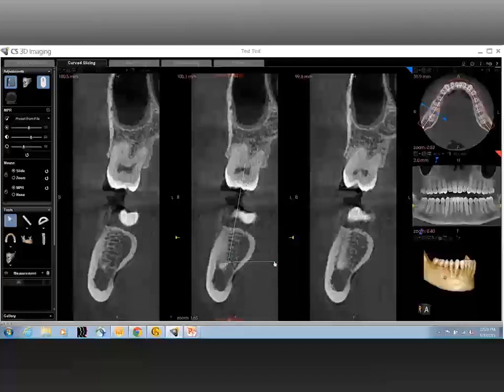Now how does it help you in terms of implant evaluation? In cases where loading of the implant becomes critical, especially in the posterior area, it is good to identify that angulation of the ridge to change any kind of angulation that is needed in the surgical procedure.